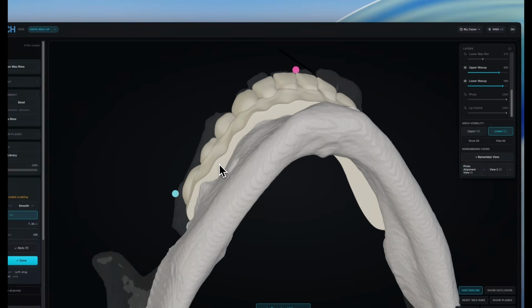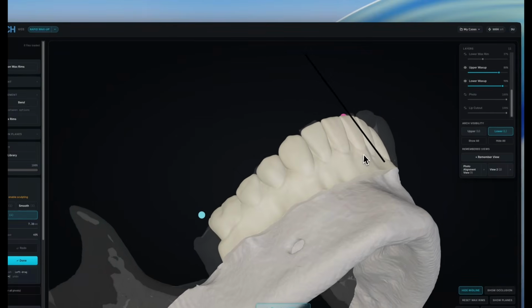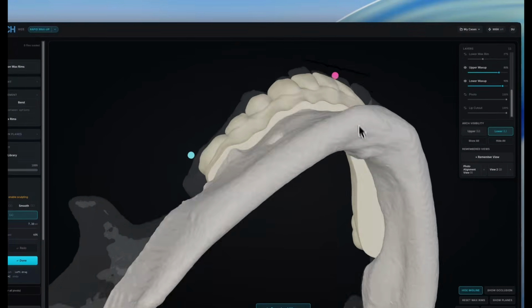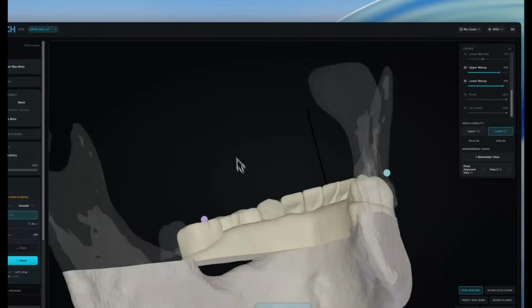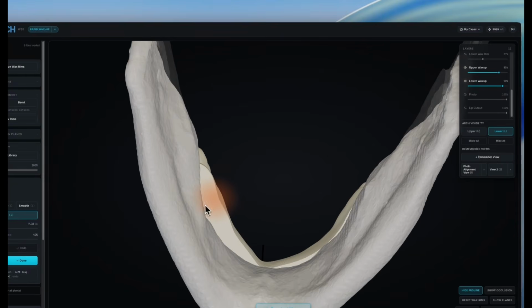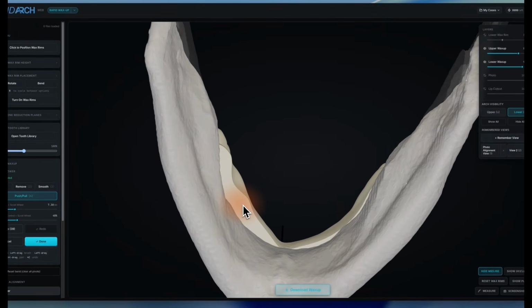With RapidWaxup, you can very, very easily design the prosthetic to fit exactly the patient's bony contours after your alveoloplasty is done. So here I'm just using the push-pull tool and just dragging everything back. And this is going to guarantee that my patient isn't going to come back to me in 2 weeks or so and say, you know, this thing is pushing out my lip and I'm collecting all this food under here, can you replace it? And then you have to go through another revision, which takes up a lot of chair time.